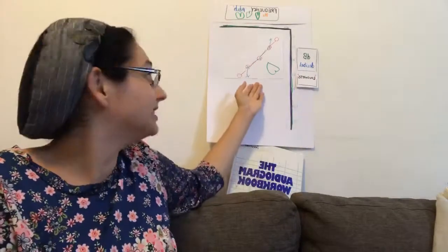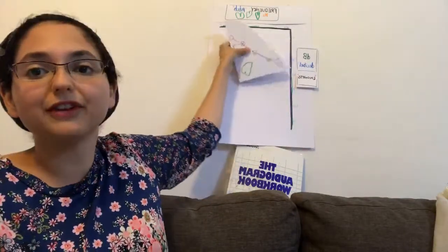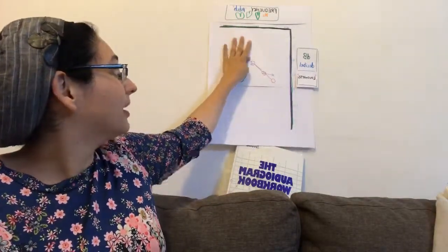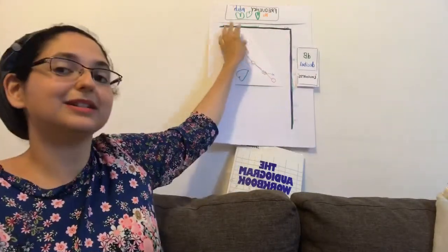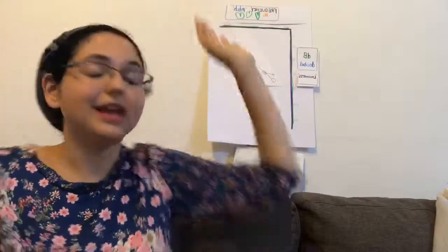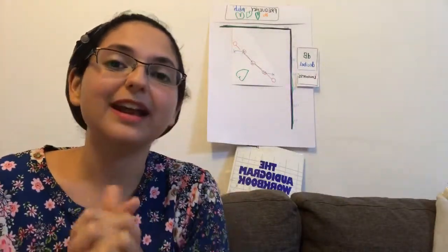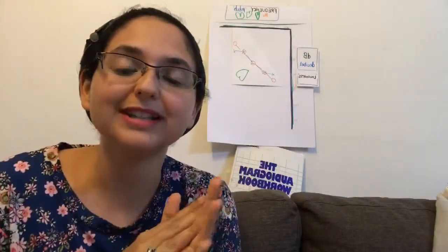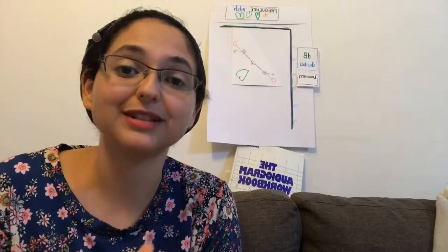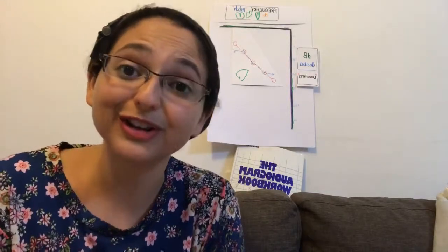And we also see something called a reverse hearing loss, where it goes the other way, where the majority of the hearing loss is in the low frequencies, and then high frequency sounds are coming in at normal. So what does all this mean? Because it's a lot to take in all at once. But when you understand the basic geography of how the audiogram works, then you can interpret whatever the results are on the audiogram that you're looking at.